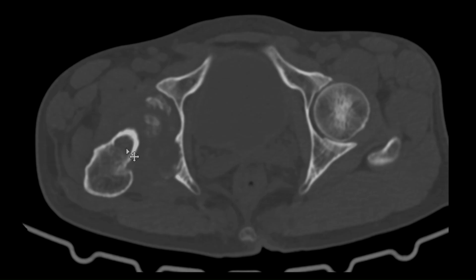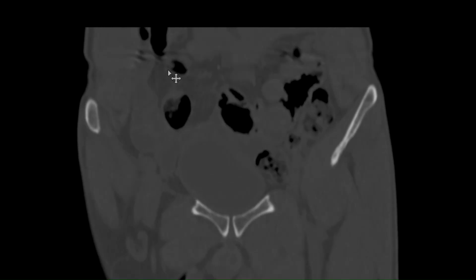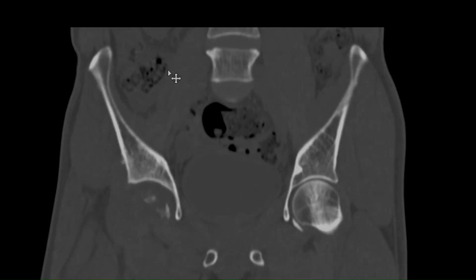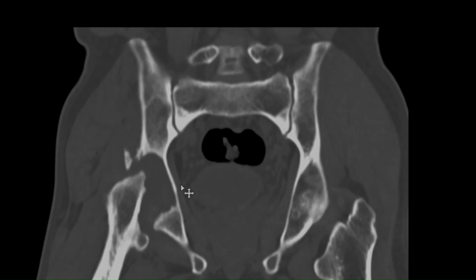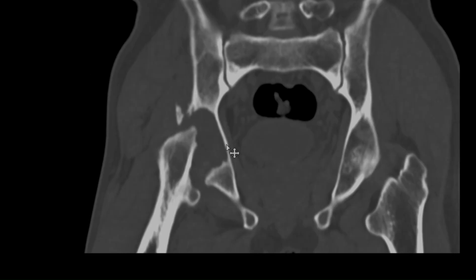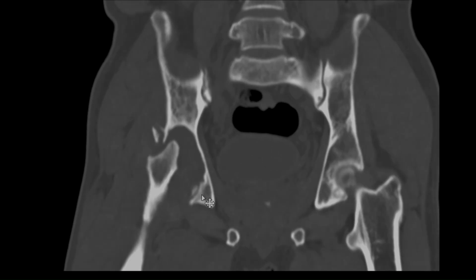So this whole appearance is not related to a septic etiology or anything, but is just a sequela of the untreated fracture. This is how an untreated fracture would go through its course, and we are able to see the dissolution, osteolysis, and this large collection is nothing but a liquefied hematoma which might have occurred then, and we now have the osseous debris within.